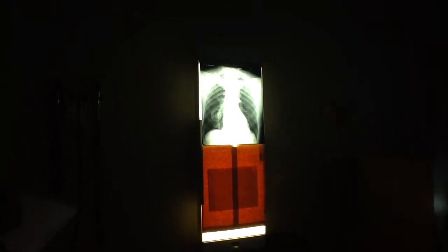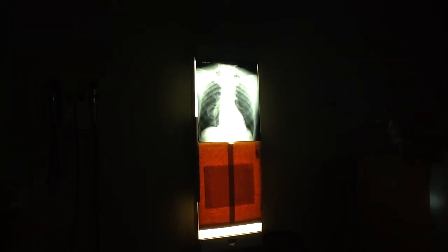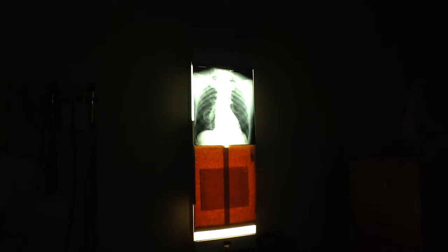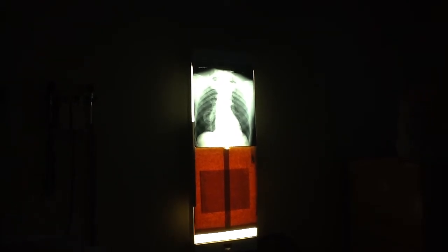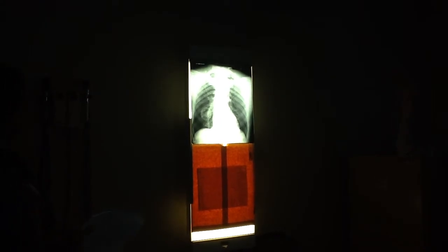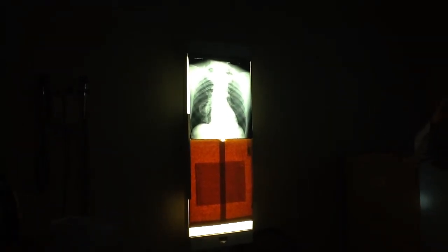There's no round fissure boundary in the lower lung. The only fissure down there is the horizontal one, and it's flat, and the major one, and it's flat. There's no round pleural boundary anywhere in the lung. So that's unlikely to be consolidation. Now, there is something called round pneumonia that can have a well-defined border. That's beyond our capability. For our purposes, consolidation is going to be fuzzy unless it's lobar or up against a fissure boundary. Now, it's not homogeneous, is it?